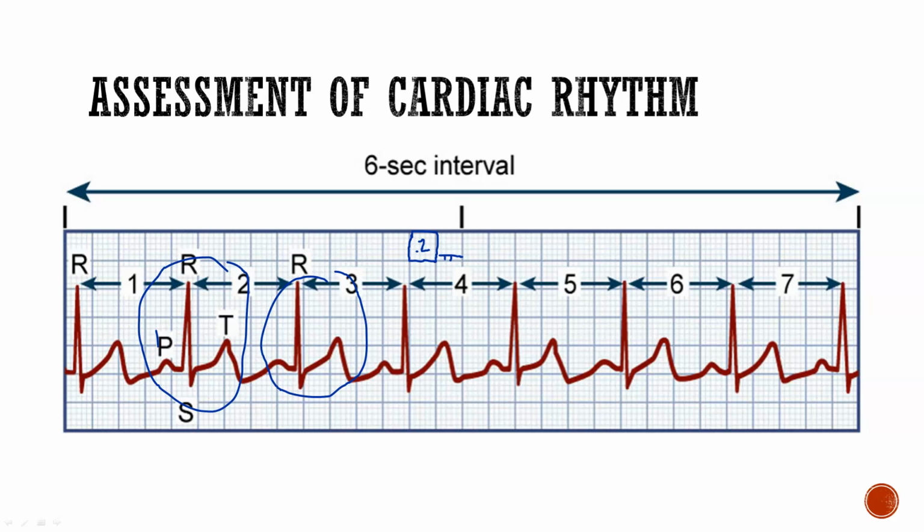So if I look at this, and I measure from the beginning of my P to the beginning of my QRS complex, that fits inside one big box. Can't ask you to measure 0.20, but what I can ask you to do is say, that fits in that big box, and if I'm going to give you something that doesn't fit in the big box, it would be noticeable.